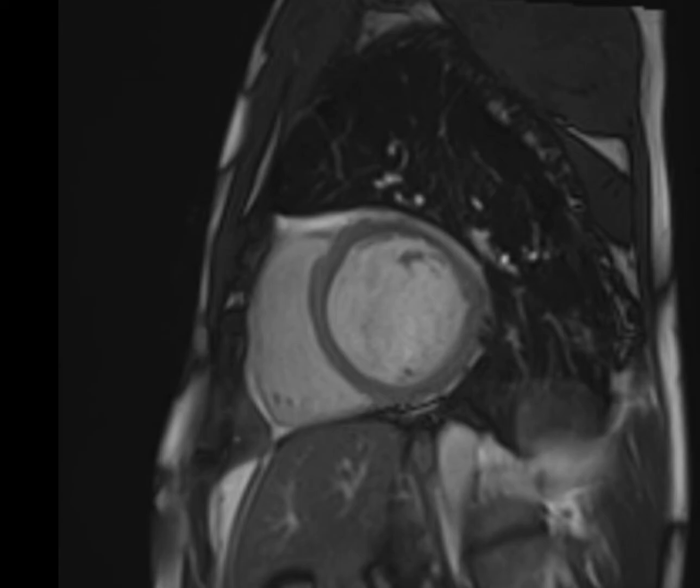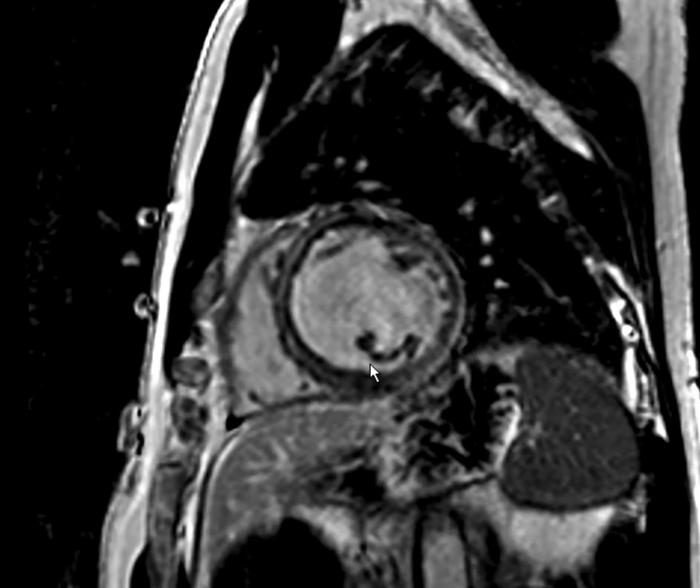As we previously mentioned and showed, myocarditis shows late enhancement. For example, in this case, this is a short axis view, late enhancement, and usually the late enhancement is acquired around 7 to 10 minutes, sometimes 15 minutes after giving the intravenous gadolinium. As you may see here, there is diffuse contrast enhancement in the subepicardial layer along the lateral wall, and there is late enhancement mid-wall in the septum. Both patterns are non-ischemic.